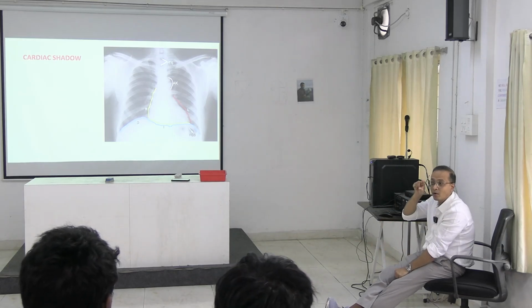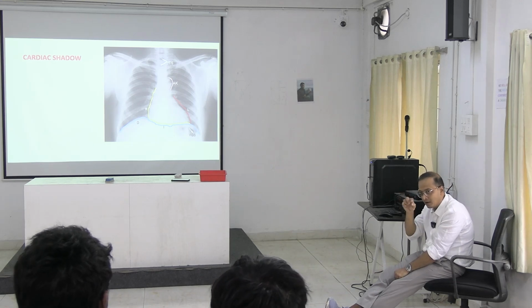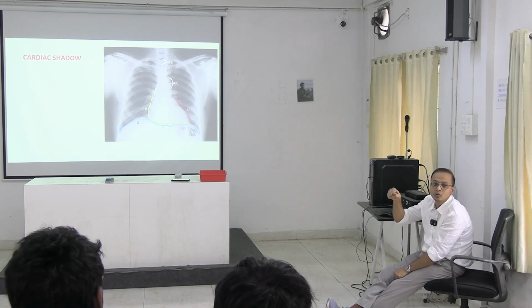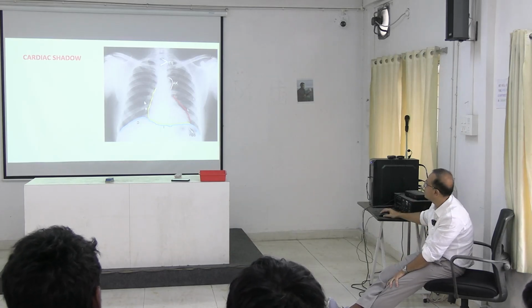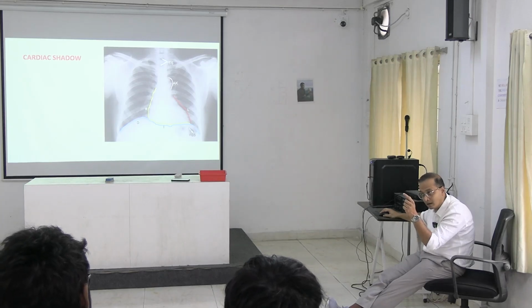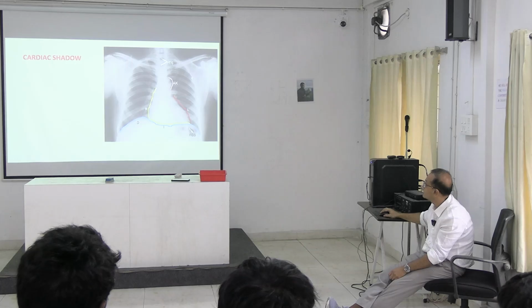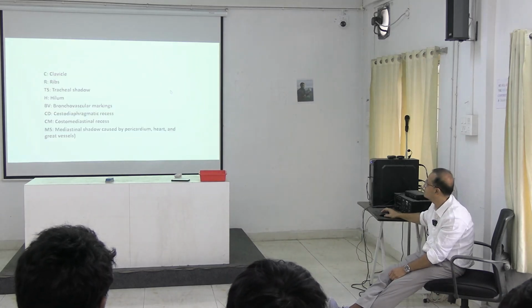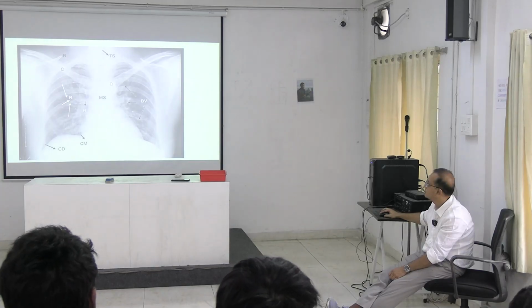As the aorta is making a bend, that particular bend radiologically looks like a knuckle. That bend is where the arch of the aorta transitions to the descending thoracic aorta. So, we call it AK, aortic knuckle. It is knuckling down. If you look at this picture as well, you can see this, right? This is what we call the aortic knuckle.